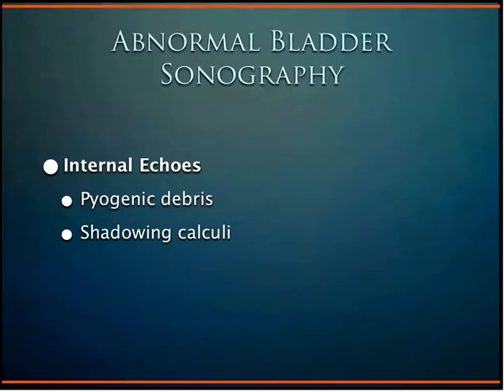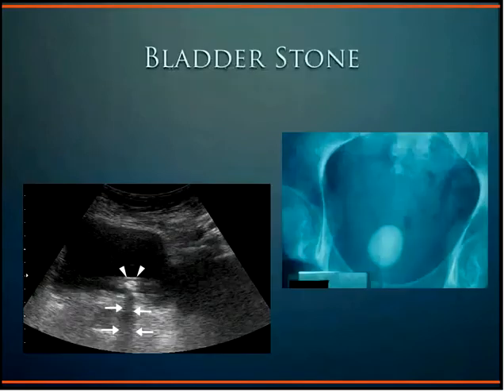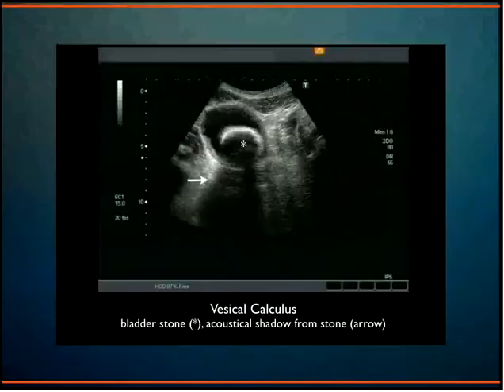If calculi are too large to exit through the urethra, they may continue to enlarge and reside in the bladder, ultimately becoming quite symptomatic. This 77-year-old female from a nursing home came in with abdominal bloating. Plain films were taken with concern for constipation, and this mass was seen in her pelvis. The ultrasound on the left depicts the bladder stone with prominent shadowing.